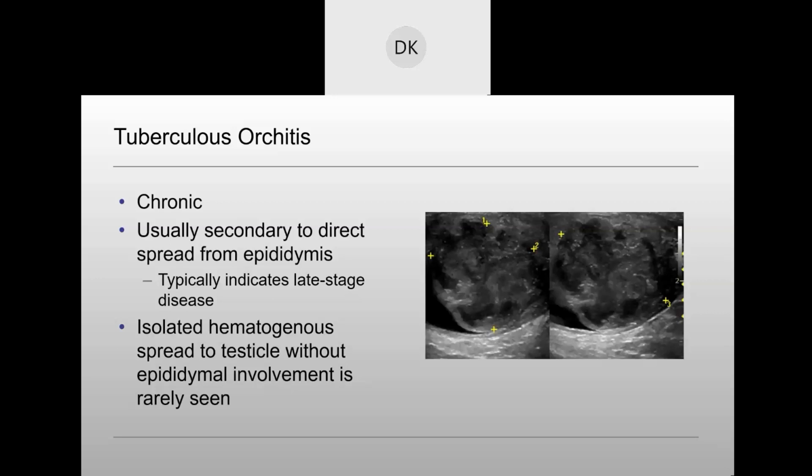Often, even though we don't see it commonly, TB orchitis will be just an enlarged testis with multiple small hypoechoic nodules. This is an example where it's solitary. But just notice that appearance, how it looks very similar to the epididymal granulomatous infection, kind of necrotic with peripheral vascularity.